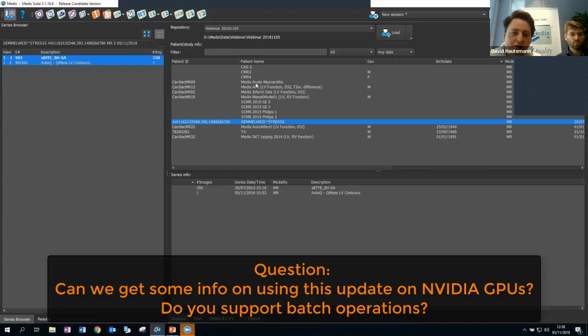So if it doesn't work with the GPU, the cases that I show you that take like 45 seconds on my laptop might take 2 or 3 minutes on the CPU. And that's my laptop. So it can depend, of course, on the hardware. I think we're running tests at the office, and we have very beefy GPUs, and it will run faster. But I think there's a lot to further enhance in the future.